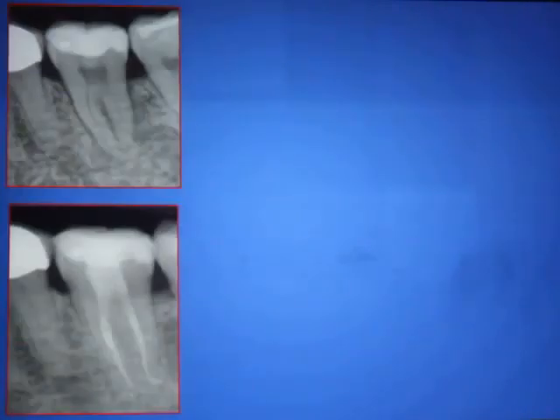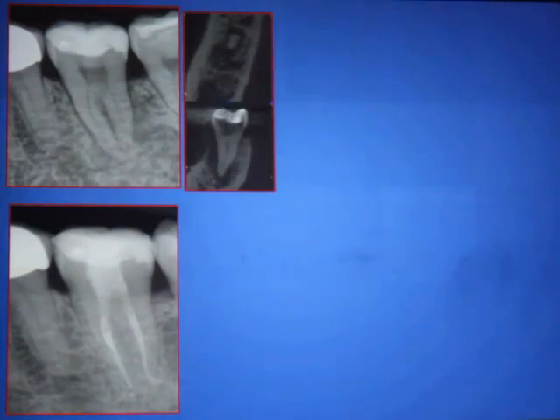So see one more example here, that is the pre-treatment area on the distal aspect here, and about 6 months post-operatively, and we see that on a conebeam CT, and you can appreciate the extension of the bone loss that is visible on the conebeam CT is far more than what you can imagine on the normal radiograph.